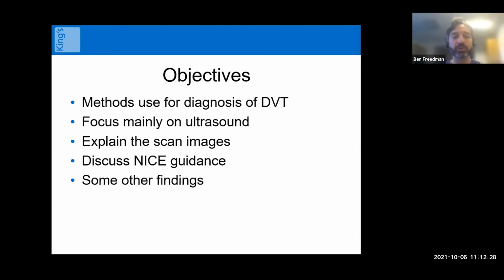So just quickly to run through what I'd like to talk to you about: the different methods involved in diagnosing DVT, but primarily focusing on ultrasound. I want to show you some scan images and explain what it is that we see on an ultrasound scan. I want to touch on the NICE guidance for imaging DVT and just a few other little bits and pieces on the side.